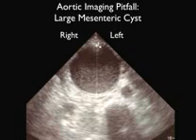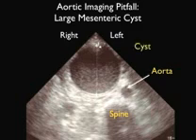This ultrasound image shows a rare pitfall on imaging of the aorta, and at first glance the large structure that's seen in the anterior part of the image here could be construed as a large abdominal aortic aneurysm, but close attention to the details of where is the spine will help in differentiating the structure. So let's take a look first at the spine, which we can see as located towards the posterior aspect of this image, and we can see the aorta located anterior to the spine.